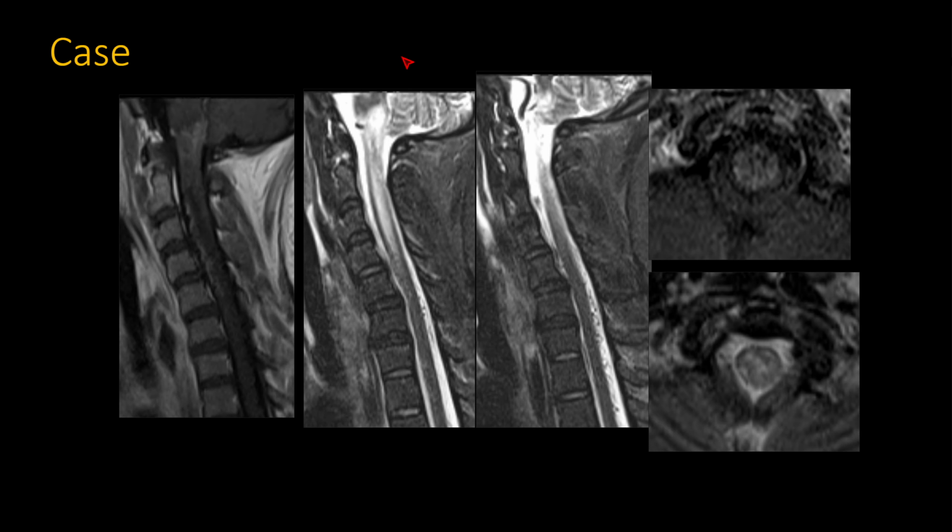Here's another unknown case to introduce us to the next category of diseases we'll talk about in the differential for transverse myelitis. Here you can see longitudinally extensive myelitis with hyperintensity going from the cervical spine to the dorsal medulla, the area postrema here. This is sort of dorsal medulla. This would be where area postrema would be. There's some patchy enhancement associated with the areas of signal change, and you can see cross-sectionally there's a sort of patchy signal change, but it involves the central aspect of the cord as well as the majority of the cross section.